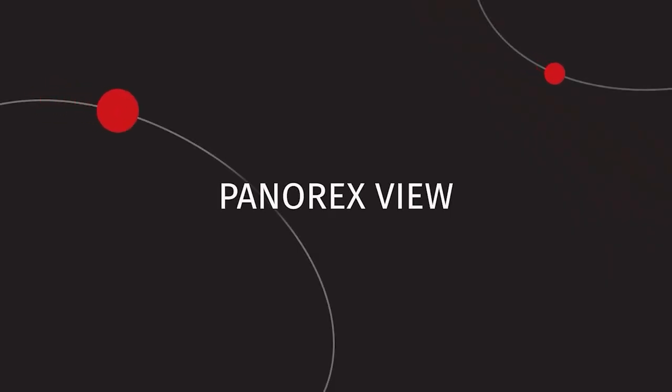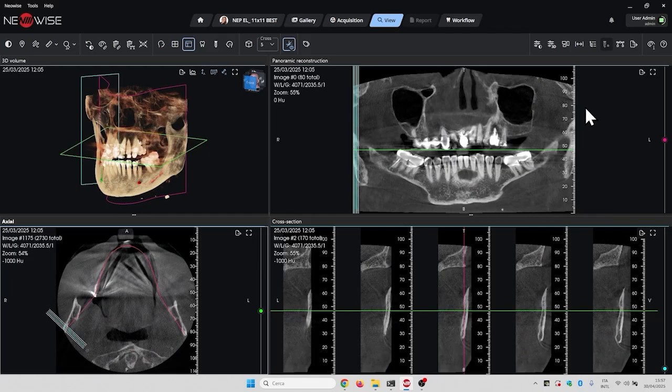Panorex. By simply clicking on the Panorex button, you can display this particular screen for you. In this view, you can take advantage of several functions.